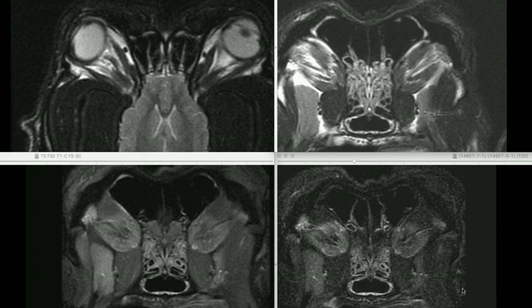And so denervation in muscle causes the so-called muscle edema pattern. So what we expect to see is diffuse T2 hyperintensity with diffuse contrast enhancement, and then usually a degree of atrophy in the subacute and more chronic cases. So the appearance will vary depending on the chronicity.